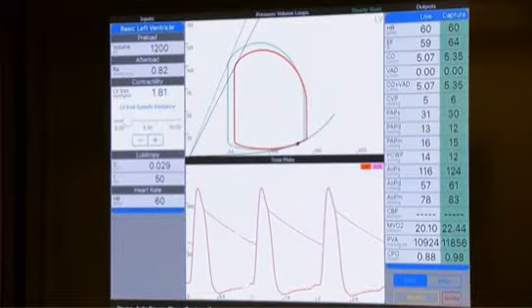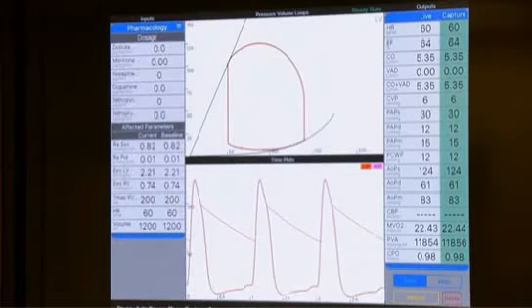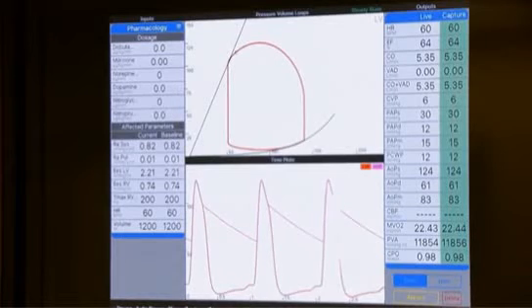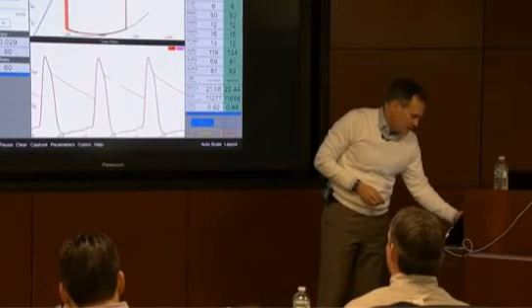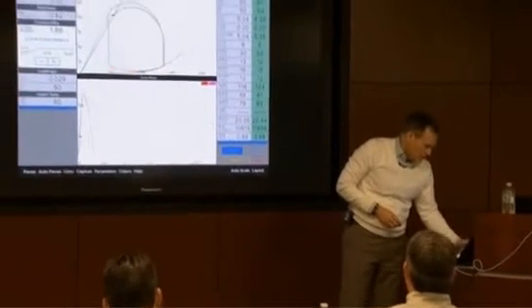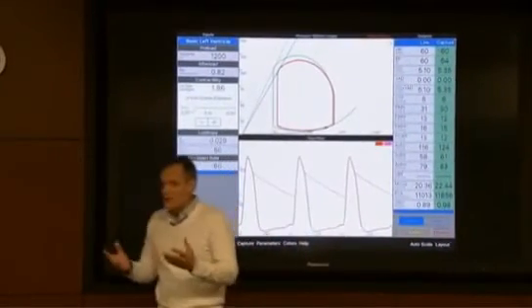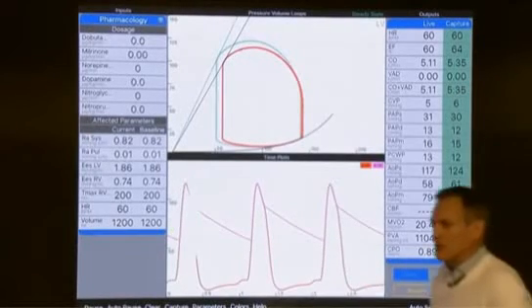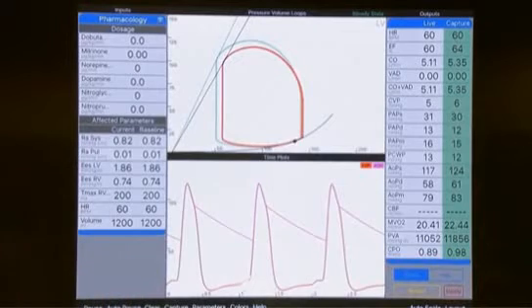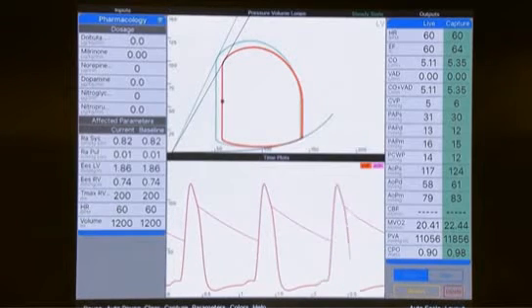But as we said before, I'm just going to go back to the beginning where we started. As we said before, clinically, the way contractility is often changed is people have an MI, right? Actually, let me go back to that patient and give them an MI. So we've reduced contractility with a big heart attack. They're having an infarct. Their pressure's down, their cardiac output's down, and the physician now is going to react to that. They're going to react probably to the low pressure, and they're going to want to get the patient's pressure up.